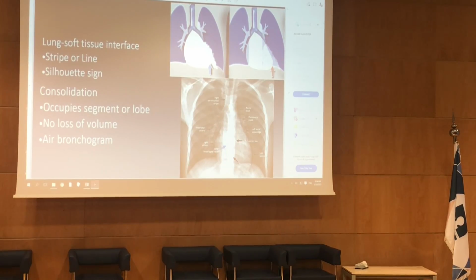So it's not hiding it, I'm seeing it through it, right? Here, it's the same density, but I no longer can see the heart margin. So when we reported in chest X-ray, we would say there is a silhouette sign, which is wrong because there isn't. It's the loss of silhouette. But this is how we're using it, basically.